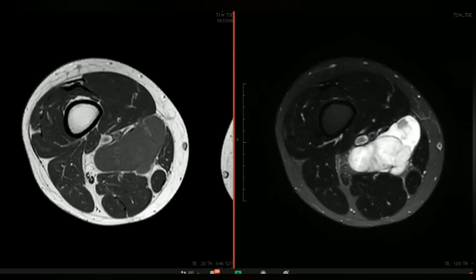Are you going to give contrast? Here are my questions for you. Are you going to give contrast? Sir, yes, contrast. Okay. Now that you're going to give contrast to the patient, tell me why you're going to give contrast. What difference would it make? I need to understand that. Sir, if it's an inhomogeneous enhancement, it is more likely suggestive of a malignant lesion, and if it's a homogeneous enhancement, then possibly a benign lesion.